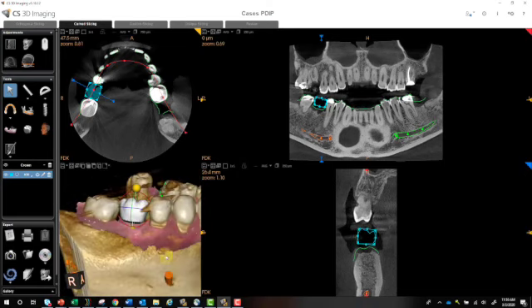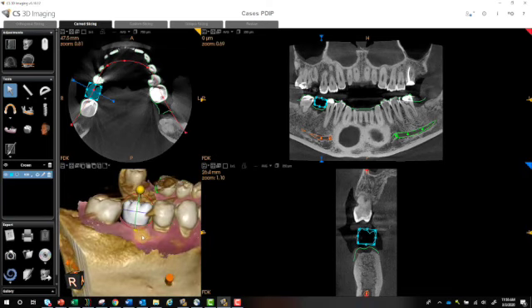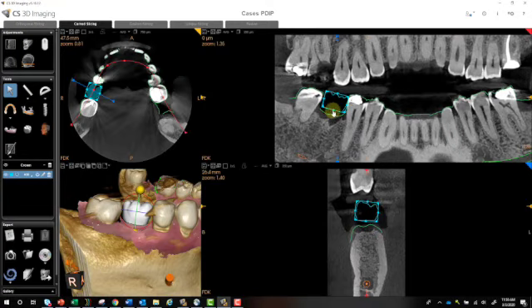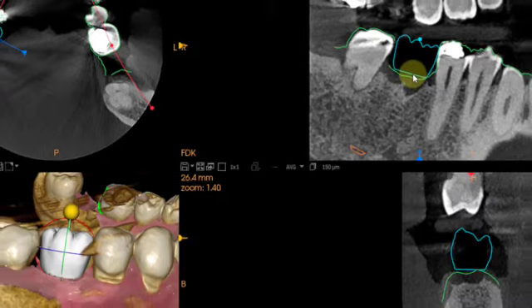If I want to stretch the crown in one dimension, for example, I want to make it longer, bringing it down closer to the gingiva, I would use the little movement handle in one of the other views. So when I put my mouse on top of this, if you look at the lower left, as I go, you're stretching the crown in just that one dimension.